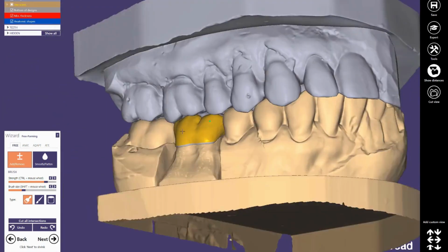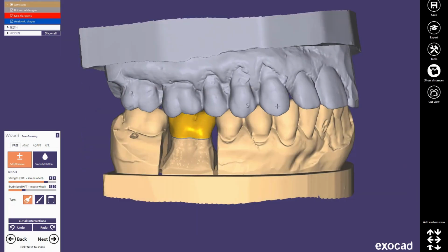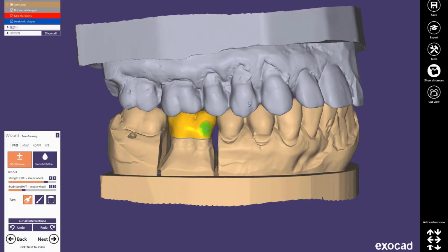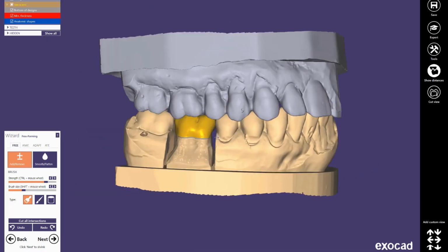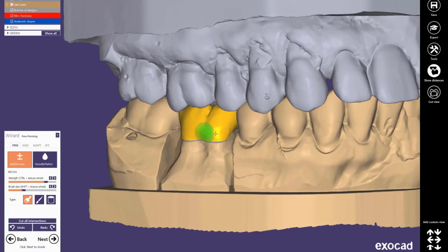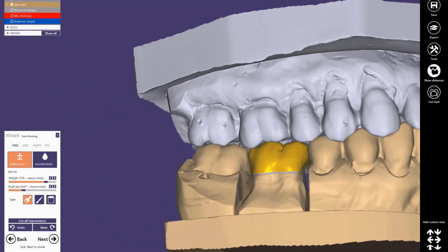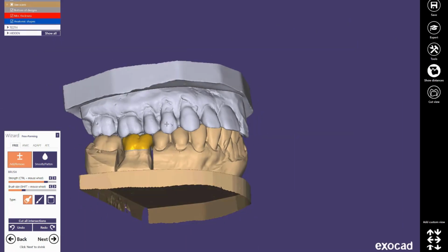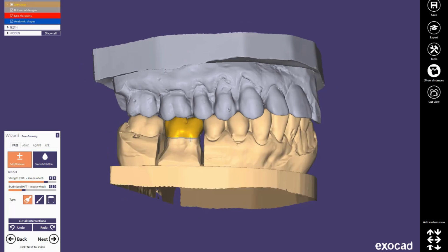It's really a good feature to use, because once you start to work on big cases and you have to switch from one tooth to another and do free-forming, whatever you have to do, it's going to be easier for you, instead of just rotating and losing yourself and not knowing where you want to be. Just click on the item with the wheel wherever you want to go, and it's going to be easier. So with that said, I want to jump into the hotkeys.